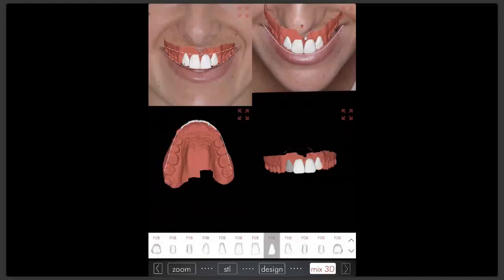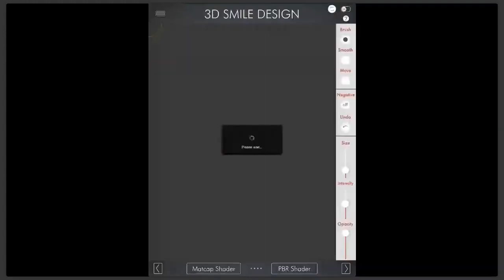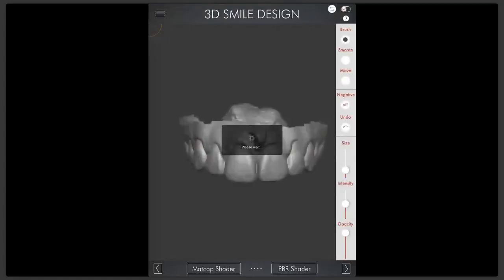Then we move forward. And now we get to the scope tool, which is our step number 4, if you remember from our sequence. So what we're going to do here is some small adjustments. Just wait, sometimes it takes a little bit to load.